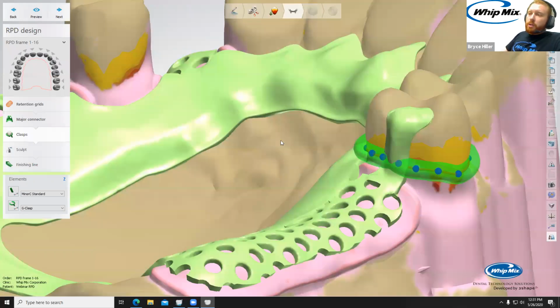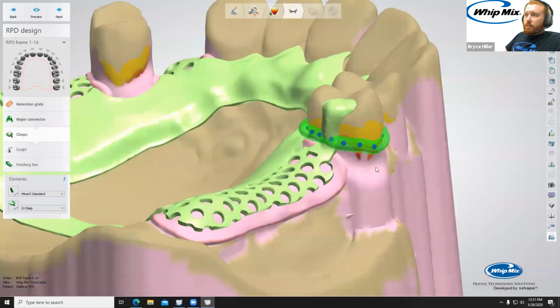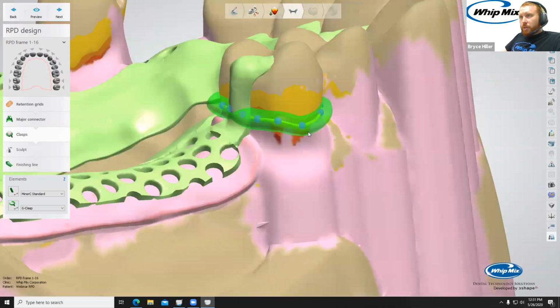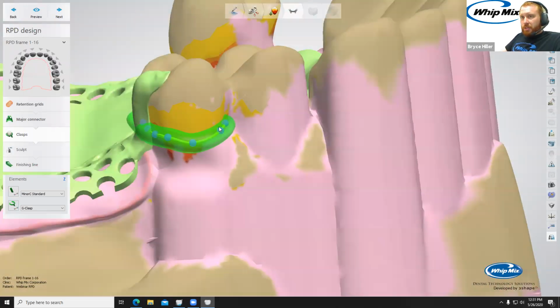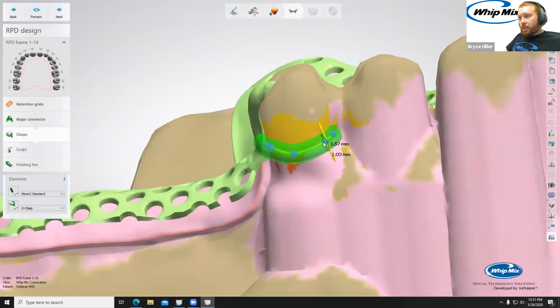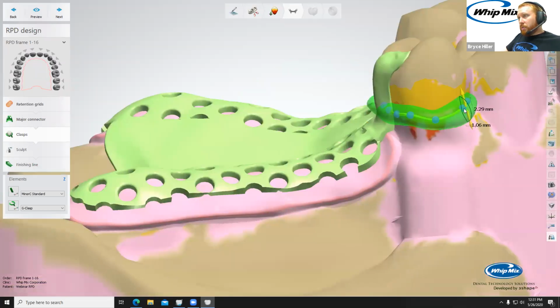From here, if you click on that spline line to select the clasp, we can hover over these control points. If I hold my shift key, you can see an icon pops up there, and if I use my scroll wheel, I can narrow or widen. Widen, not whiten, widen. Can you whiten that clasp?